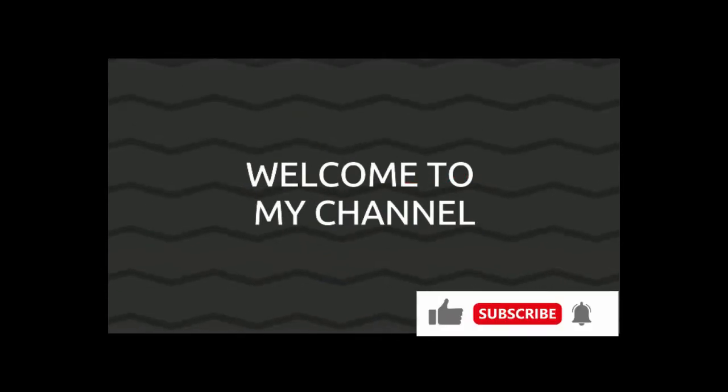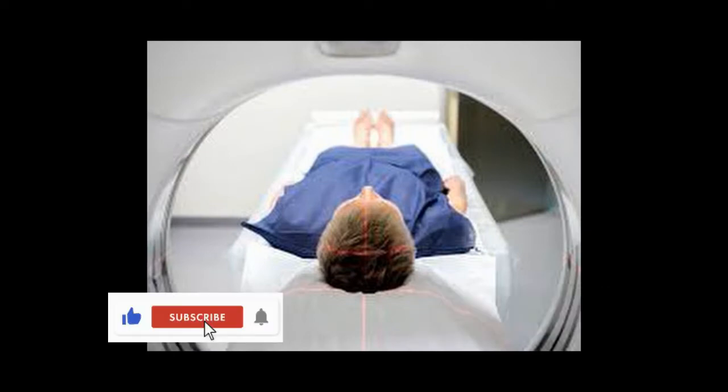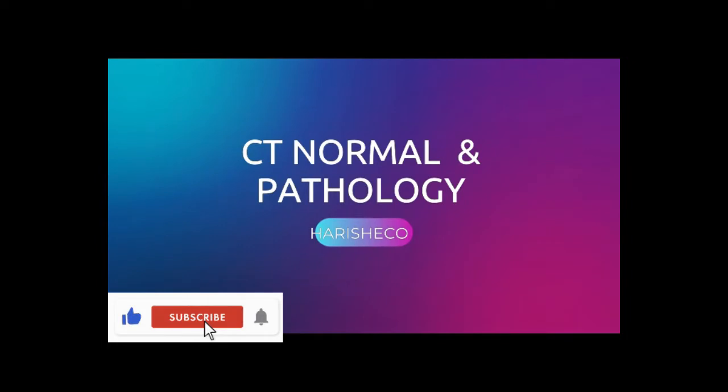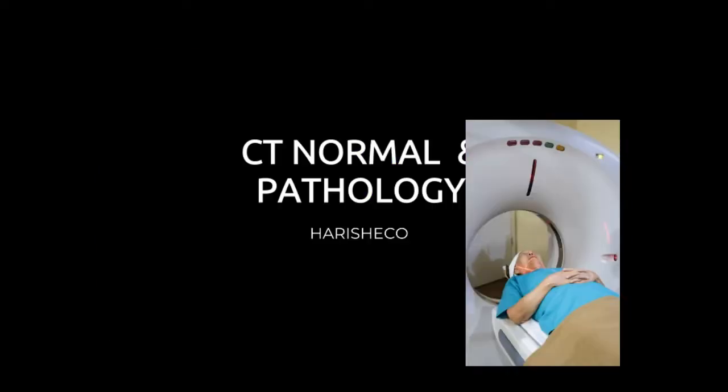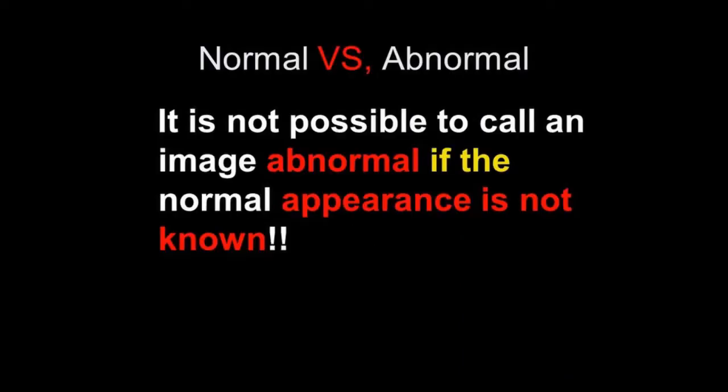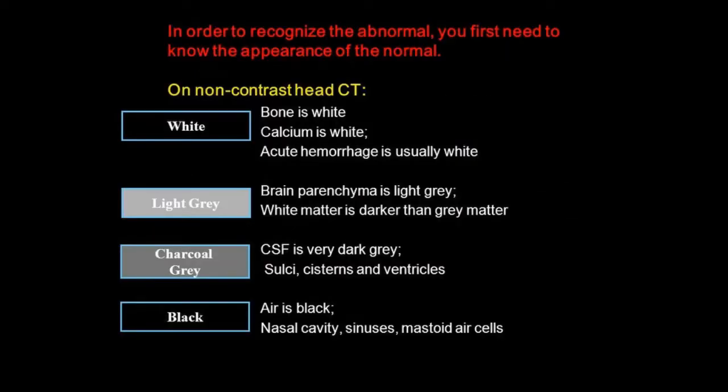Today we are going to study the CT scan of the brain. Let's see how it looks normal and what pathology can be seen in a CT scan. Normal versus abnormal. It is not possible to call an image abnormal if the normal appearance is not known. In order to recognize the abnormal, first we need to know the appearance of the normal.